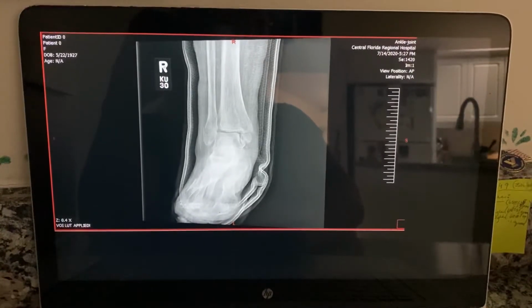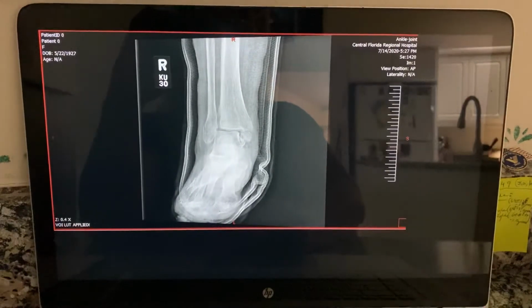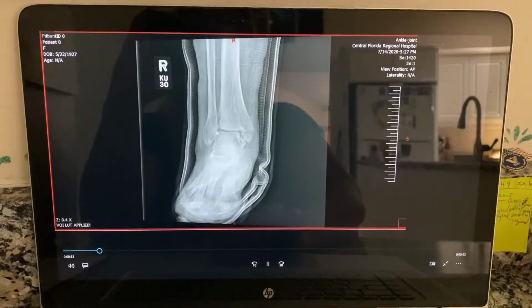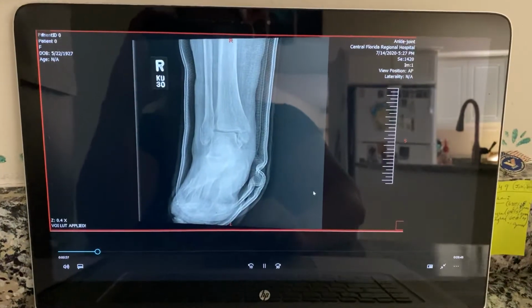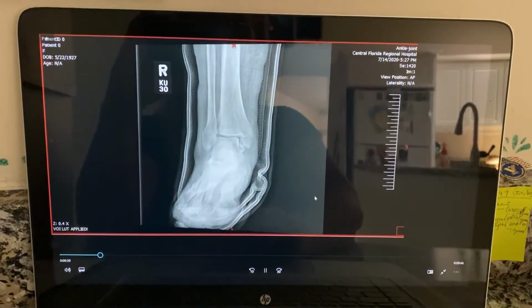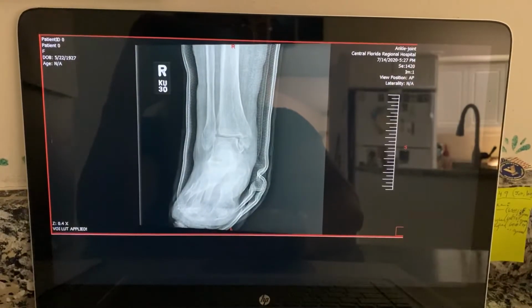This was the AP supine with the patient on a stretcher with a tabletop IR. The central ray is directed perpendicular to the IR and midway between the malleoli through the cast. Patient positioned supine with her leg extended.